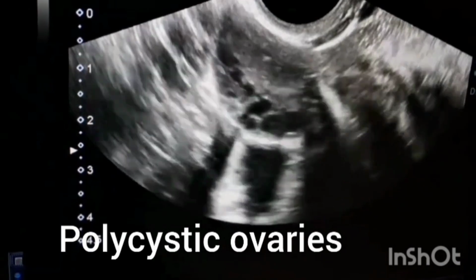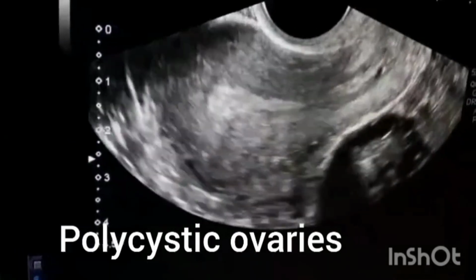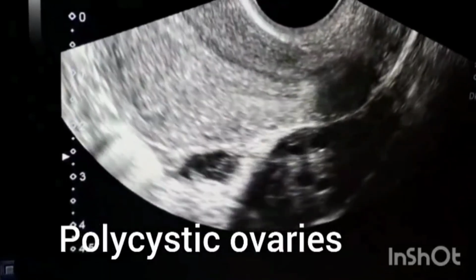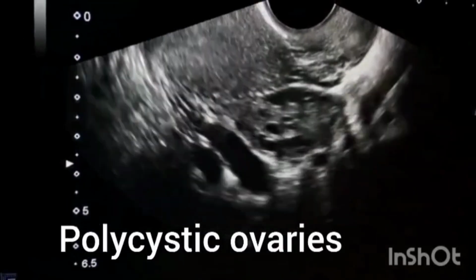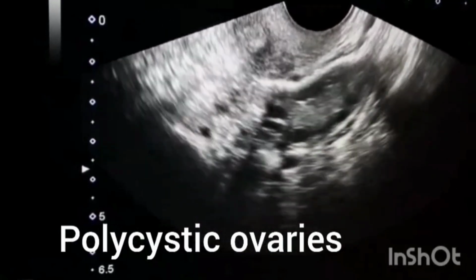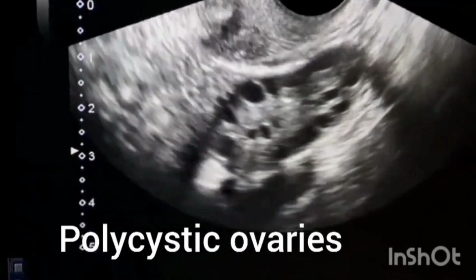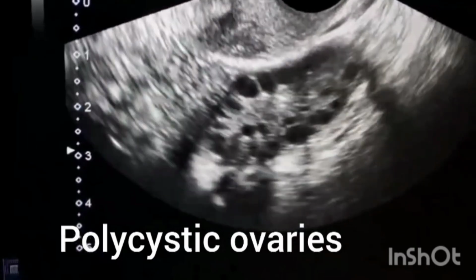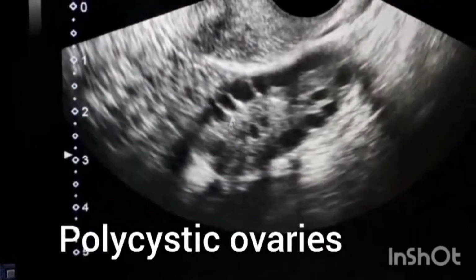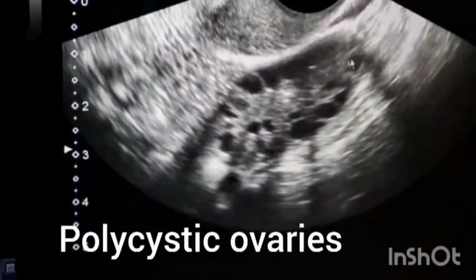And if we look at the endometrium, it will be echogenic. Typical trilaminar appearance is very rare. It is echogenic endometrium, and in the ovaries, peripherally arranged small follicles, all less than 10 millimeter in size. No dominant follicles seen.